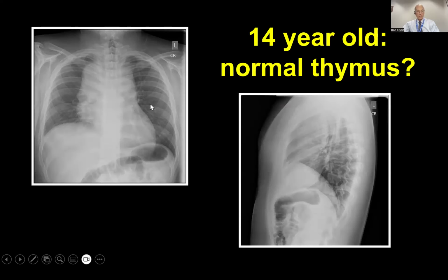We're looking at the lung areas. The lung, you want to look at the pleura, which is okay. The pleural space is okay. The bones and soft tissues are okay. Upper abdomen. But there's way too much soft tissue here.